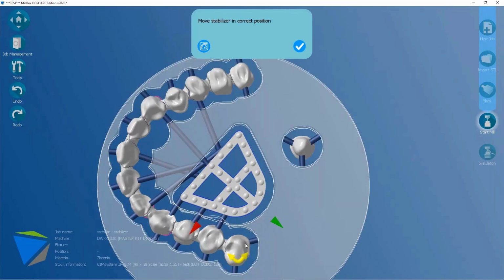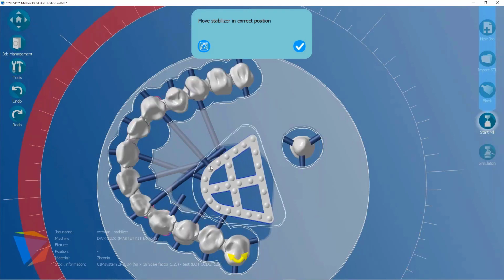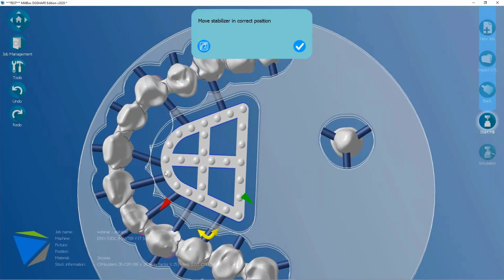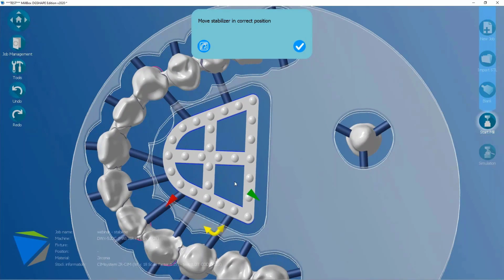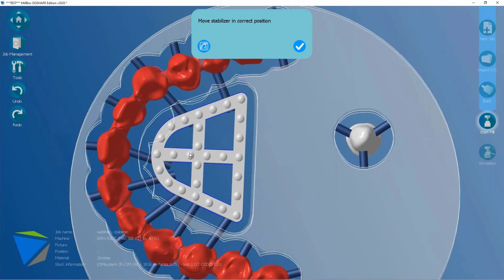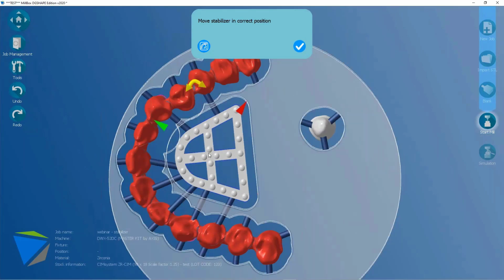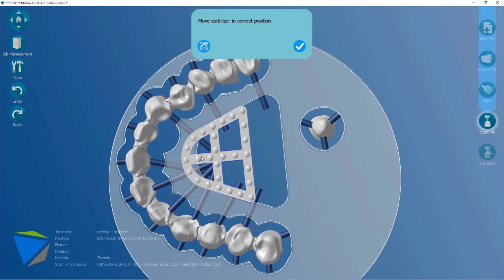Now, simply adjust, because it's an external STL file. So the system gives me the chance to adjust it according to my desired position. For example, here, of course, now choose one. It may be smaller. However, here you can adjust it and then confirm. Maybe put it here close to this area. Of course, it's red because I overlapped the offset areas, for example. Then going back, and that's it, and confirm. And this is the way to use this kind of extra custom-made bars.